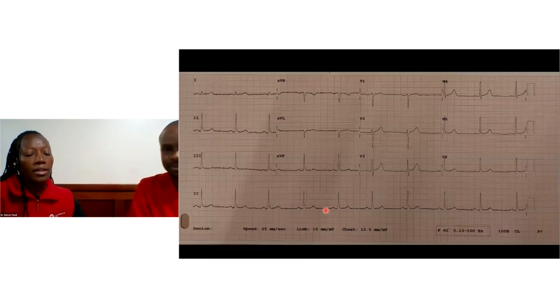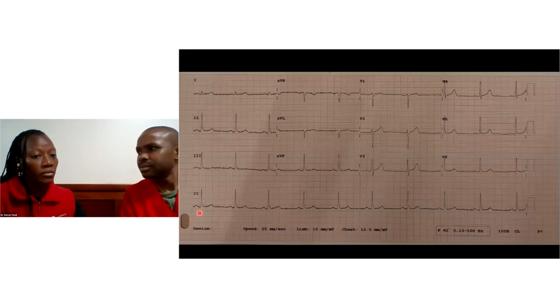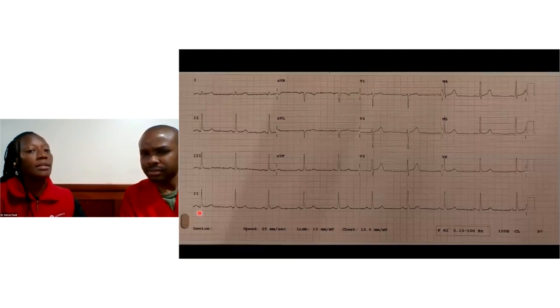Very good. So as all that is happening, we have tracings. We have said that it's a graph. We have a tracing over here, and that is the first one. It's called a P wave. A P wave is traced when the electrical activity is conducted from the SA node, sweeps across the atria to the AV node. So that positive deflection is what we call a P wave. And the ideal would be the normal heart rate, what we call a sinus rhythm, should always have a P wave, meaning that it is originating from the sinoatrial node, Dr. Nelson.